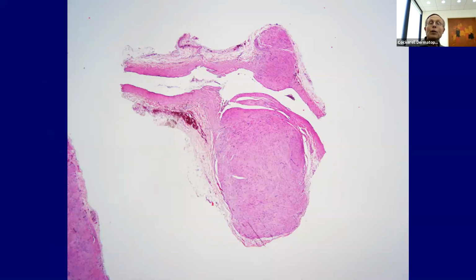Okay, another enucleation biopsy in this case. So once again, probably felt like a cyst. Again, anytime something feels like a cyst, you should have some respect for that, because once again, there are lots of things that can present in the skin that we think are cysts. We cut into them, and they're not. They can be adnexal tumors, they can be metastatic lesions, they can be things like neural lesions, muscle lesions, all sorts of stuff. It can look like a cyst, or they can just be a regular cyst, but they don't have to be.